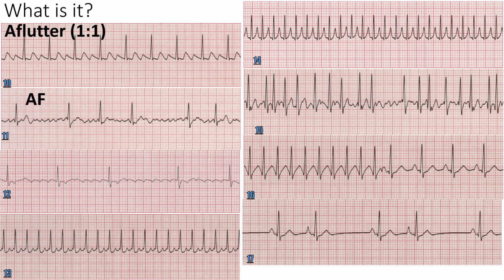What kind of A flutter? So it's slow ventricular response, right? And does it have regularity to it? It's 1, 2, 3, 4, 5 humps, and then 1, 2, 3, 4, 5, 6, 7 humps. No. Okay. Variable, and it's slow ventricular response. And how do you know it's slow? Well, it's irregular. So what method can I use, the 300 or the 10x method? 10x. So yeah, 5 times 10 is a rate of 50. Next one.